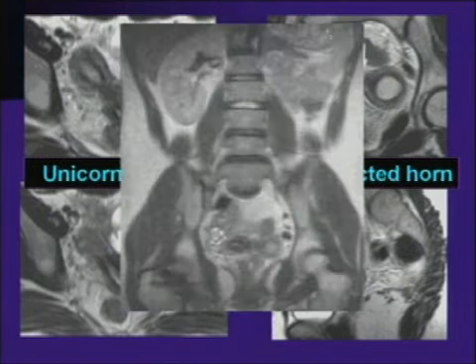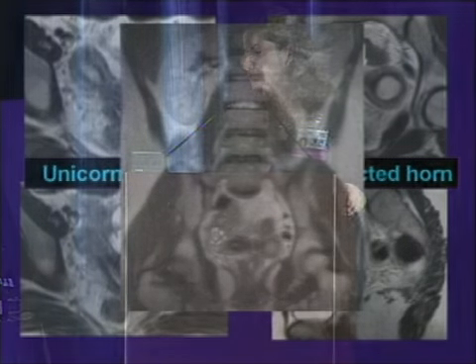The patient also had absence of the left kidney and an unusual variant as well in the pelvis. I noted an absence of the left iliac and external iliac vein, and an unusual vein coursing actually in the presacral location. So all these things were extremely helpful in terms of planning of how to deal with this mass.